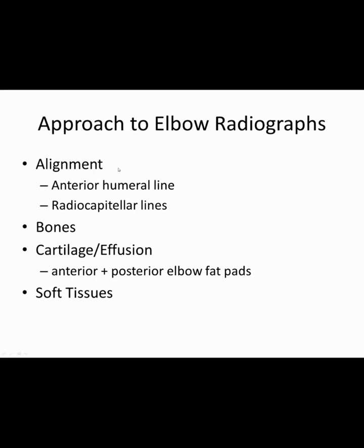So this is one approach to elbow radiograph interpretation. I'm showing you the ABCs mnemonic because it can be easier to remember when you're starting out. Different people will have different approaches to interpretation. It's just important that you're consistent and systematic so that you don't miss a pathology.